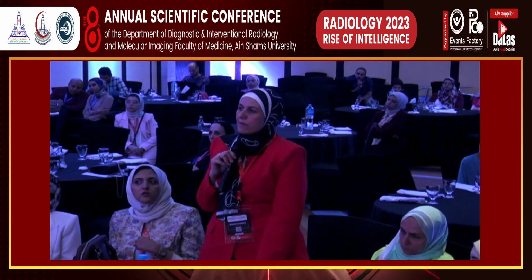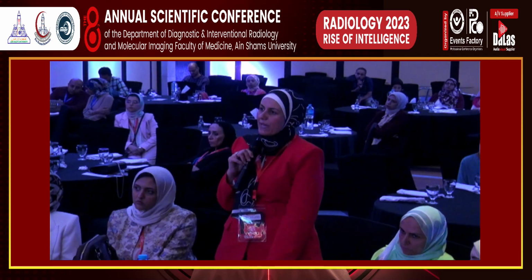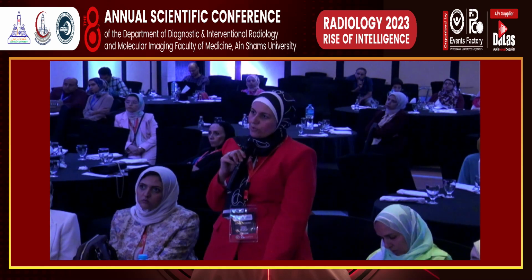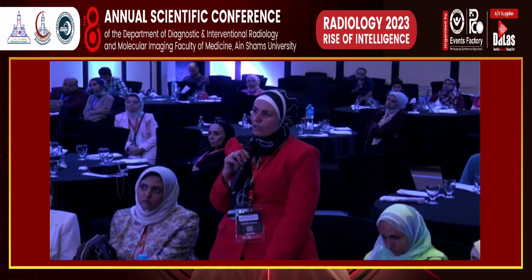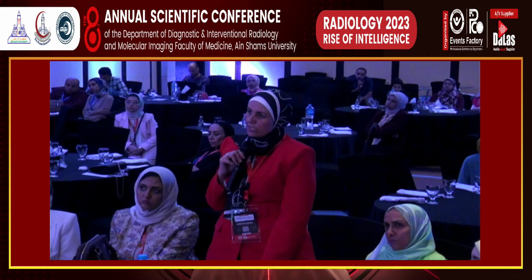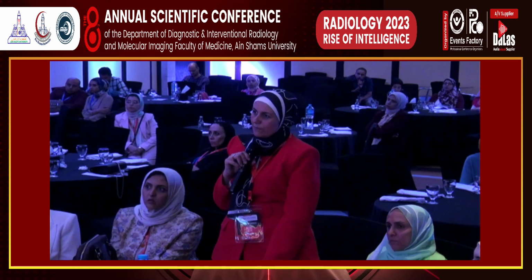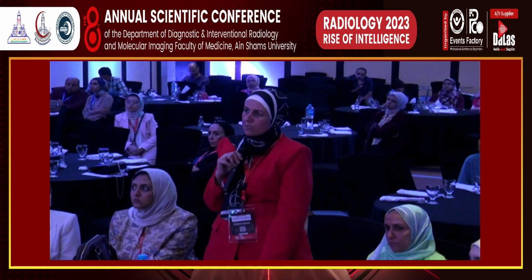يعني الديفيوجن هيبقى مور هيلبفل، خاصة إن البانكرياس بيبقى حواليه إكستنسيف فايبروسيس وأدهيجنز جامد أصلا من البرايمري تيومر لأن هو بيبقى فايبروتيك وبيزيد أكتر بعد التريتمنت. فهل ده فايبروسيس ولا ده ريزيدوال تيومر؟ ده اللي بنقدر نفرقه بالديفيوجن. فالديفيوجن هيبقى مور فاليبل في البوست تريتمنت إيفالويشن.